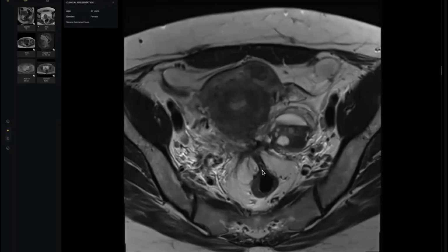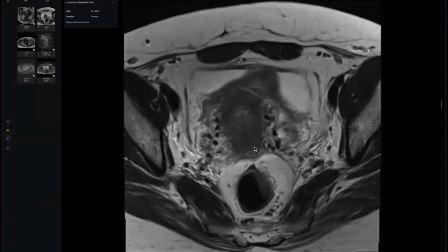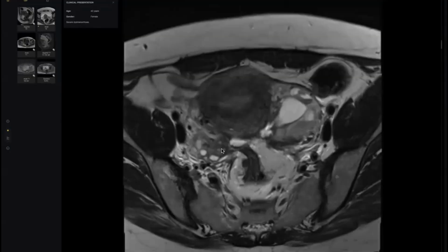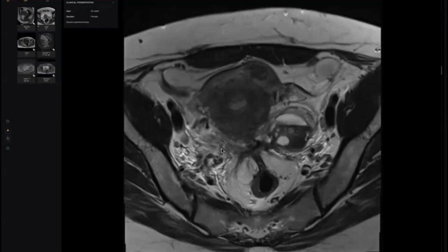This sign, I see a fibrotic band from here, the rectum, to the uterus, to the left adnexa. It could be a clover leaf sign. The deep pelvic endometriosis, my colleagues, takes one of two signs. See the fibrosis. Can you imagine it causes a cross-like fibrosis, and it causes tethering of all the adnexa to each other. So this is a clover leaf sign.